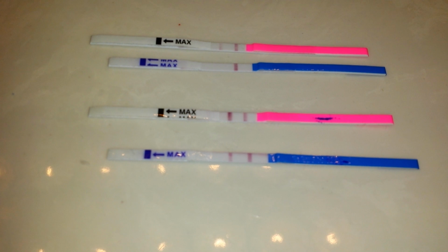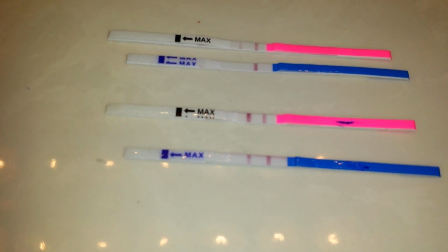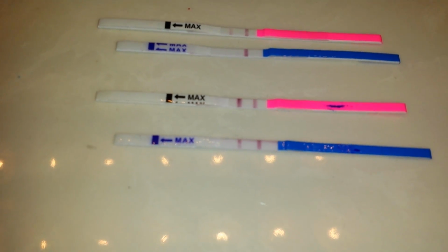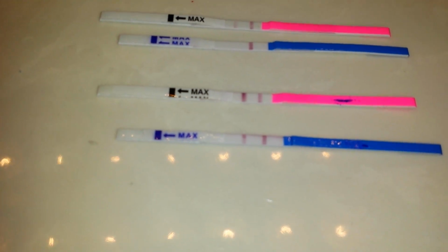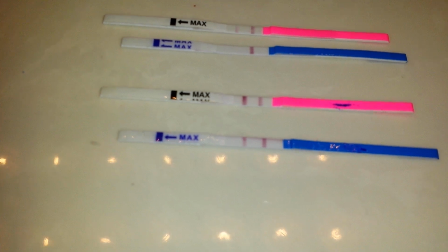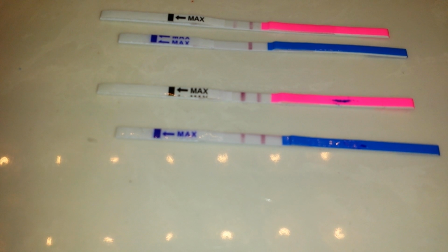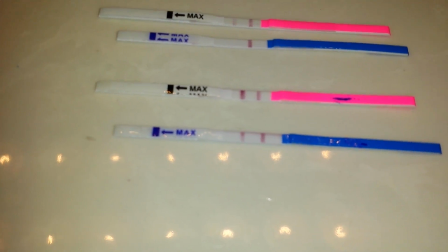My theory behind this is it's not going to come out positive on an OPK unless you're using a highly sensitive test, meaning it would have to be below like 20 MIU, because a normal OPK is 25 to 40 MIU, and they have pregnancy tests that are way more sensitive, like 10 MIU, even First Response, which I believe is 6.5 MIU.